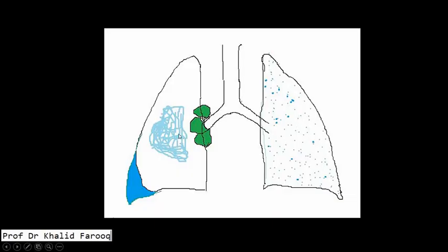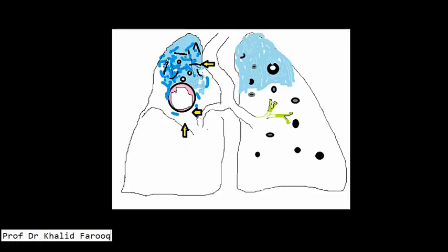Lymphadenopathy, consolidation, and effusions can be seen in one case altogether, while they can be seen separately as well. So these features are typical in primary tuberculosis, while in post-primary tuberculosis or secondary tuberculosis, where reactivation of disease process takes place, we see consolidation in any portion of the lung or in any zone of the lung on either side.